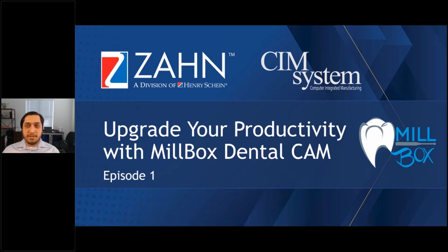We are an open CAM solution, and of course, here today to show you a couple of new pieces of information that I think could be very helpful to either users that are considering purchasing MillBox, or in particular users that maybe already have MillBox, or some of our previous released products like Sum3D. That's our legacy CAM software that was replaced by MillBox. What I'm going to be showing you today are some of those core new features that you can expect to see in those later versions. So without further ado, let's jump into it.